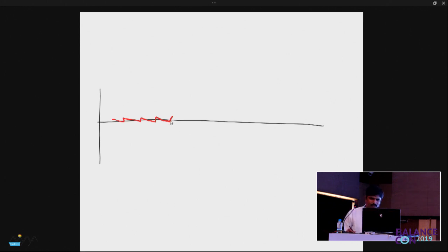Now, it is not just about right beating nystagmus. What is this? Right beating on right gaze. So that is the key point. Now, when you go back, this is right beating on left gaze.